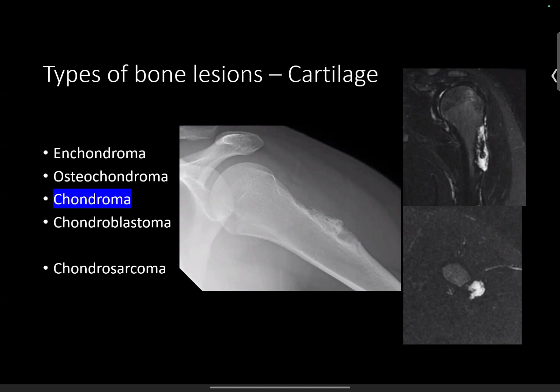So many non-cartilaginous lesions are bright on MR. What do you use to tell them apart? One thing that I like to use is the margin of a chondroid lesion on MRI. Chondroid lesions and chondromas in particular, if you look at it very carefully and zoom in on it, will have a microlobulated margin, not a smooth margin, not a round margin.